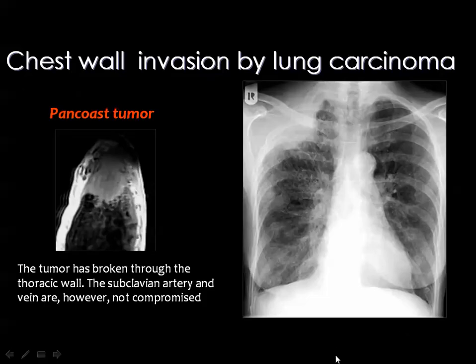And you remember that the Pancoast tumor is one of the common lesions involving the chest wall. And one of the diagnostic criteria of Pancoast tumor is the destruction of the adjacent ribs near the lung apex. And if you see a lesion which is associated with destroyed ribs, the first rib is destroyed and the second rib is also destroyed, then you think of Pancoast tumor.